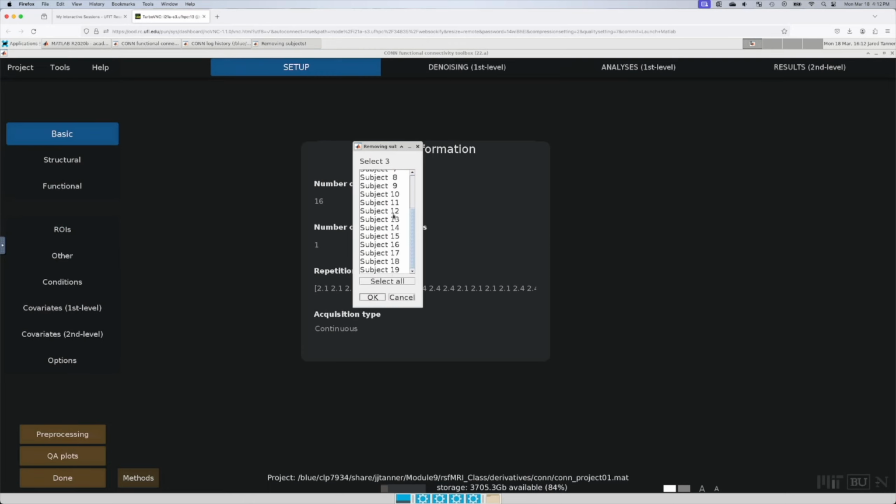So no, these have been reordered, and by reordered I mean who was subject 20 before is now subject 19. And so we already got rid of subject 15. This is why I'm going from the top down. And so subject 13 would be the next person, and that person has not been reordered.